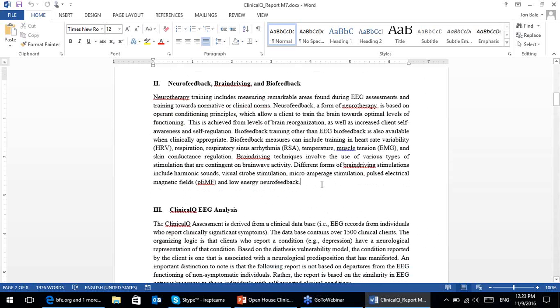In some of the interpretations, if the individual has anxiety, I already know that HRV is also a really good method that you can combine with neurofeedback, but the ClinicalQ and BrainDryvr suite, and by extension, the ClinicalQ Report Writer, does not take that into direct account. So you can combine that using your own preferred method or way of visualizing that information.